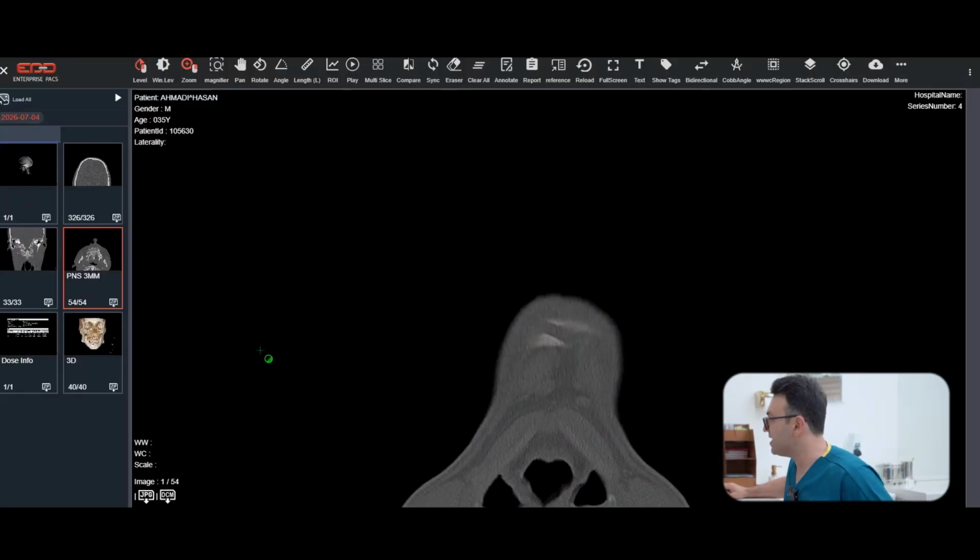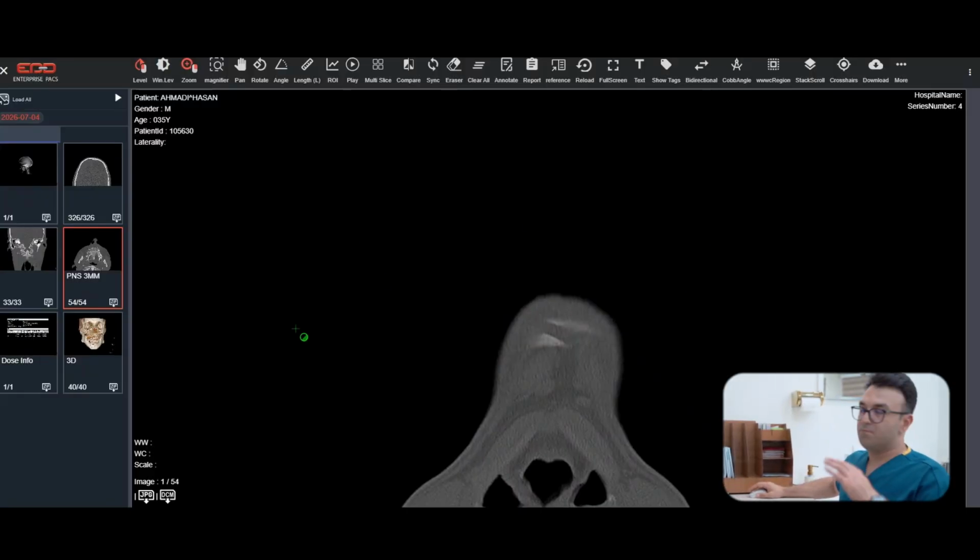Okay, so for checking the trauma and the fracture lines, we try to assess where there are overlaps or where there are gaps. It means that we evaluate the gaps and also the dense lines, which also show a fracture because there are overlaps. So we check from top to bottom or from bottom up. That's a technique for evaluation, and also for the surgery, to start the trauma case and for the fixation steps. To start the CT scans, I check from bottom to up.